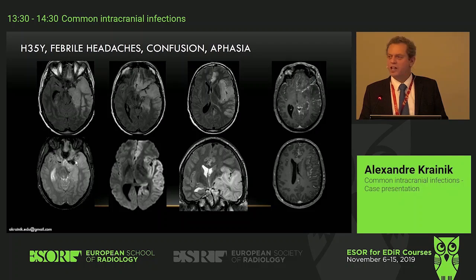You were talking about hypointensity? Hyperintensity. Okay, in the temporal lobe, amygdala, hippocampus as well, all the outer part of the temporal lobe, but also the frontal basal area, the cingulum area. Herpes encephalitis. Yeah, it must be.